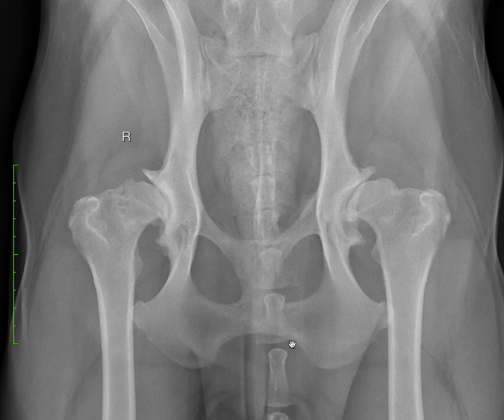When I'm ready to look at the hips within my ABCDs routine, I then go into assessing the 3 main points for hips: coverage, congruity, and degenerative changes. Let's start with coverage. Coverage refers to how much of the femoral head is within the acetabular cup.